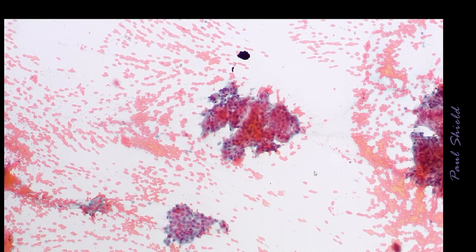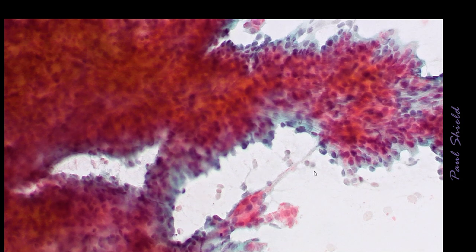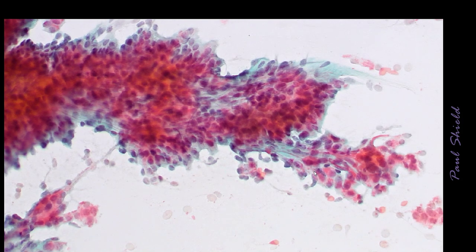So the real diagnostic essential component for reliably diagnosing papillary lesions are those fibrovascular cores to the groups. Remember, we saw large epithelial groups in the fibroadenomas, but in this case they differ by being true papillary groups having a fibrovascular core. So see how the epithelial cells are just sort of fronding off those edges.